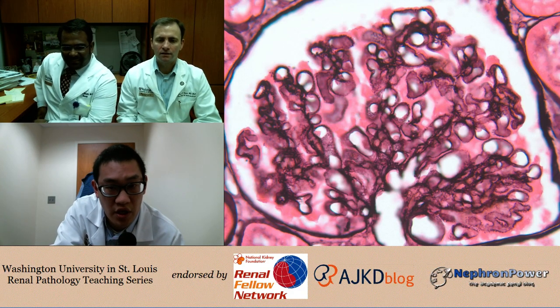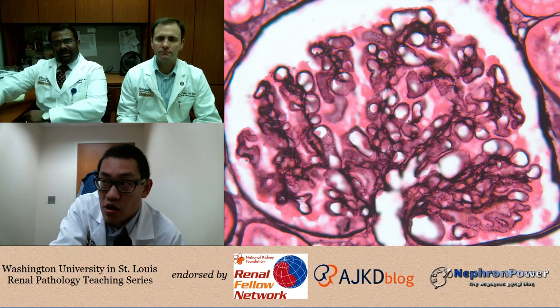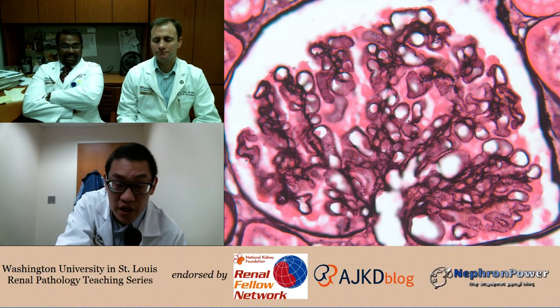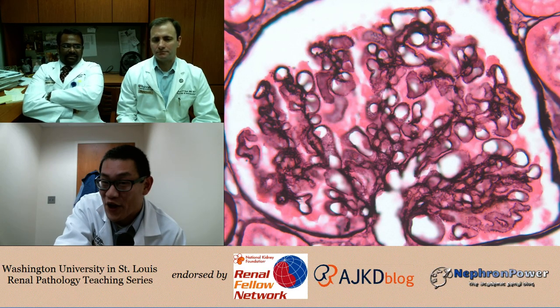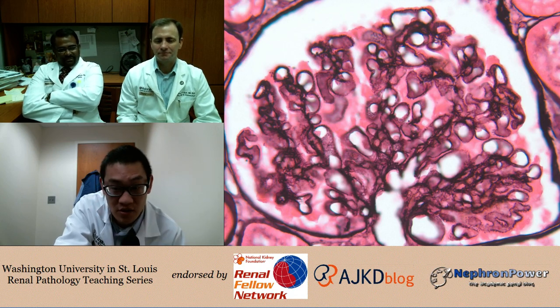If you are looking at immunofluorescence, what would you expect to see in membranous, Raj? Well, good question. If it's idiopathic, I would say IgG4. Okay, right. And if it was, let's say, lupus? Then the others. The others being IgM, IgA, C3, C4, a full house pattern. Right? Okay, good.